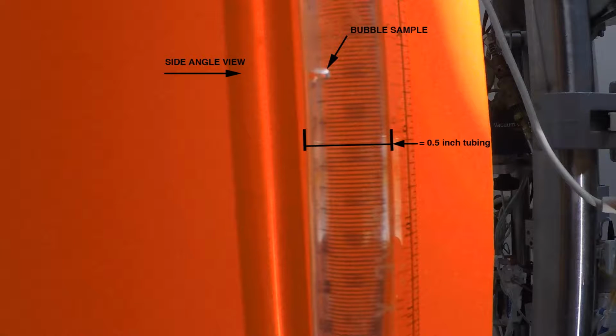In this first part of a three-part series, we will explore the buoyancy forces of air bubbles trapped within a clear blood analog fluid flow. In the first view, we start by estimating a macro bubble's size by counting the number of bubbles that can be accommodated in tubing with an inner diameter of a ½ inch. We can see that the bubble in this view is approximately 3,000 microns in diameter.